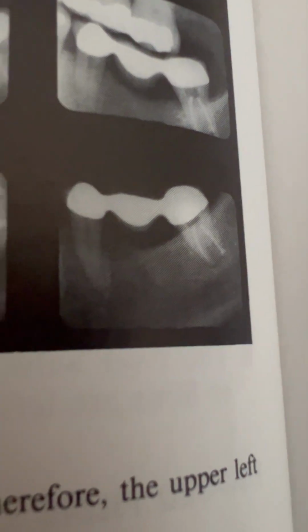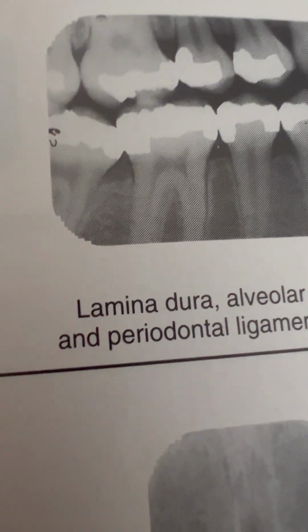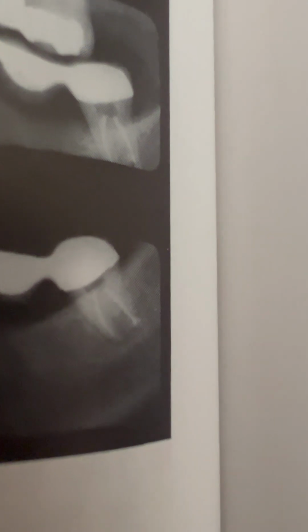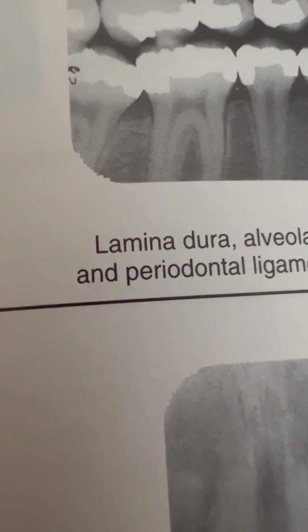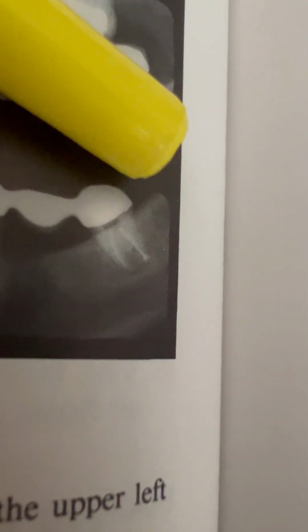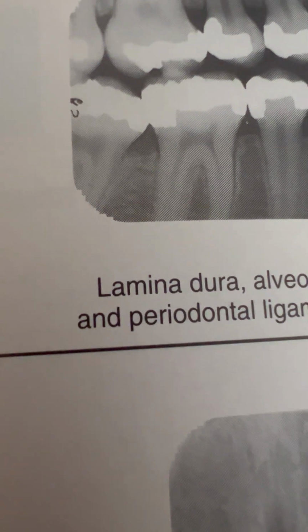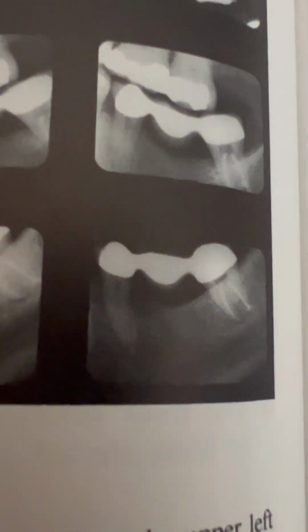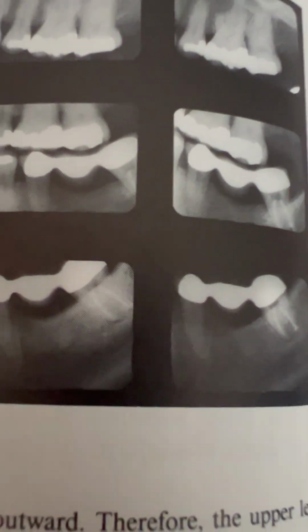And you notice that this one looks a bit different. This pulp looks different from that pulp. Do you see the difference with that one? See that right there? Those two lines into the nerve. So this tooth actually had a root canal. See the difference with that one with the filling as opposed to that one? Okay. And that's a bridge that's on that, and that's on the lower.